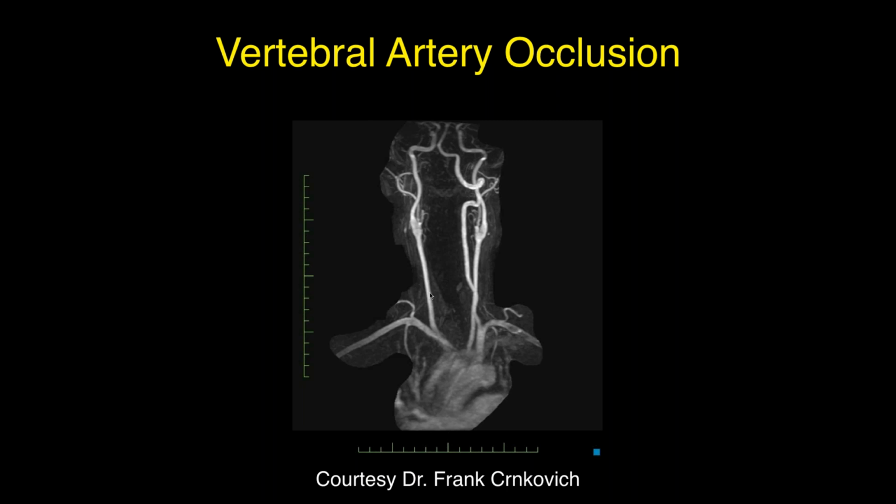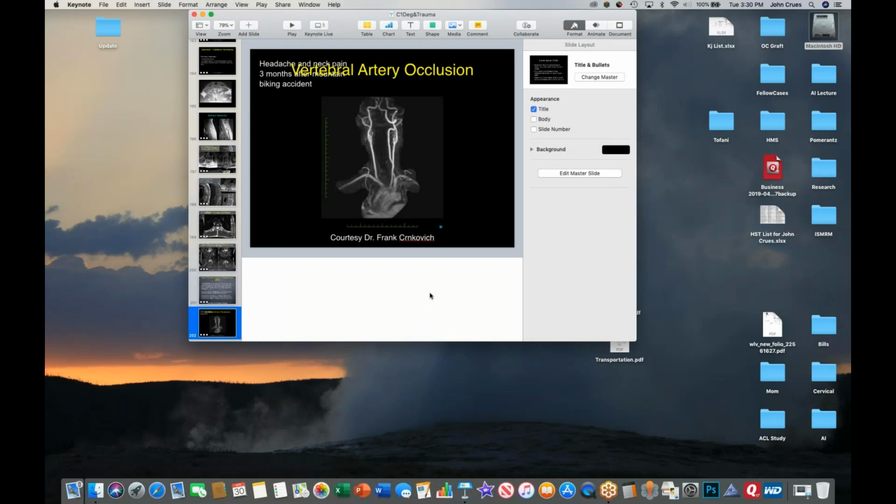And the patient presented with neck pain. Trauma is probably going to be dissection, right, in a young patient? Probably. That artery can be missed, and it has been missed in the past quite a few times.